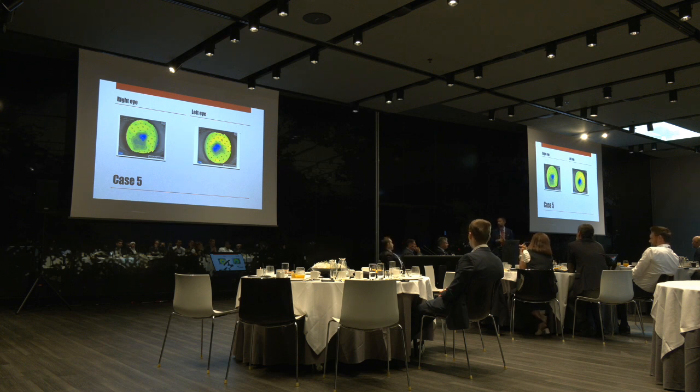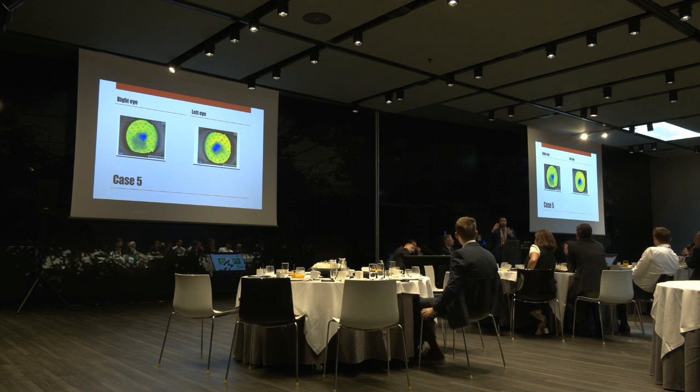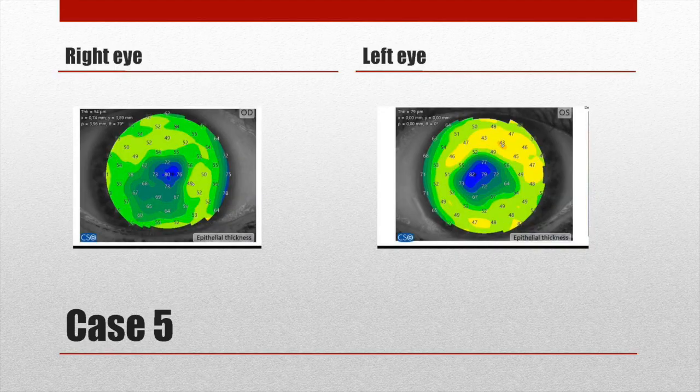It's the first time in my life I've seen a keratoconus with an extremely thick epithelium, but it's very low depression. I've done it 5 times, to be sure. I've seen some with thick epithelium where they lost tissue in the center because of repeated scarring, but it's not those cases. From the point of view of the stroma, the keratoconus is mild. It's not advanced.